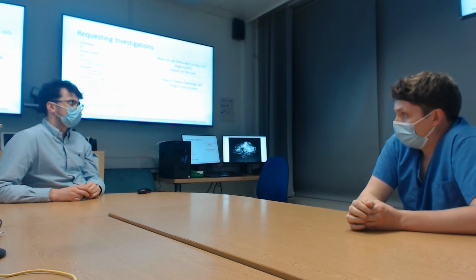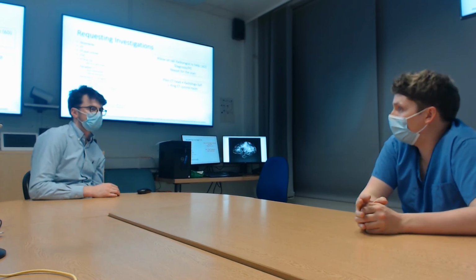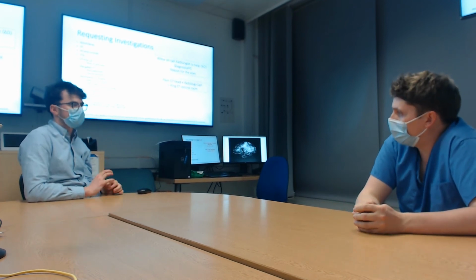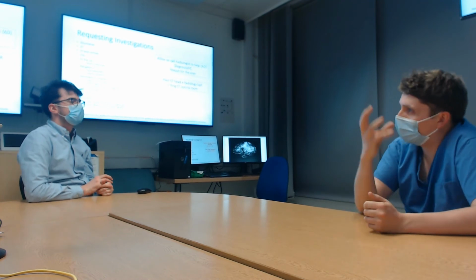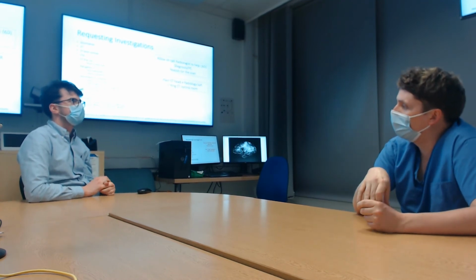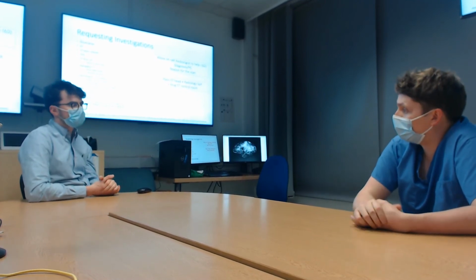Right, and that's done to assess if a patient's got an aneurysm. But it can also be used for most neurovascular conditions, like fistulas or AVMs. It's a little bit different from a CTA because you can see the flow of the fluid travelling through the whole malformation, whereas on a CTA it's just a plain cut, a snapshot in time.